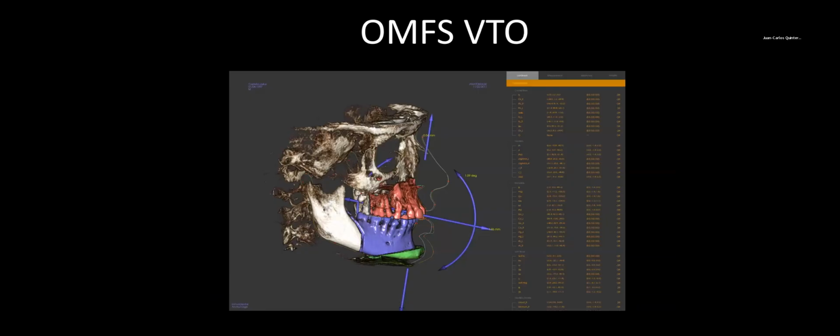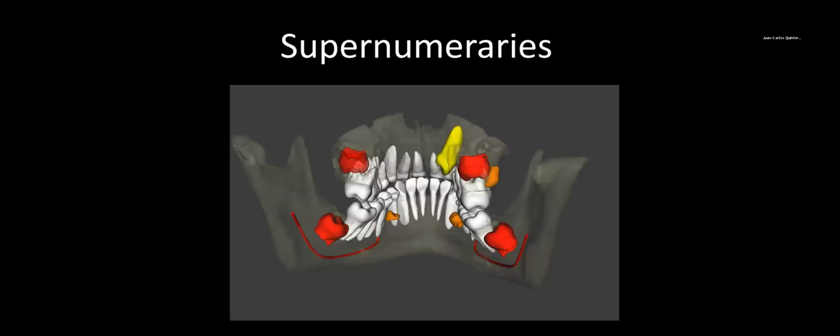With the Invivo model comes the cephalometric analysis, which I didn't really show you, but in the software, once you have this segmented, this would be part of the parent segmentation. It has features in there where you can play around with orthodontic movements and simulations, and you see the soft tissue change, and you see the soft tissue cephalometric values change to better normalize them.